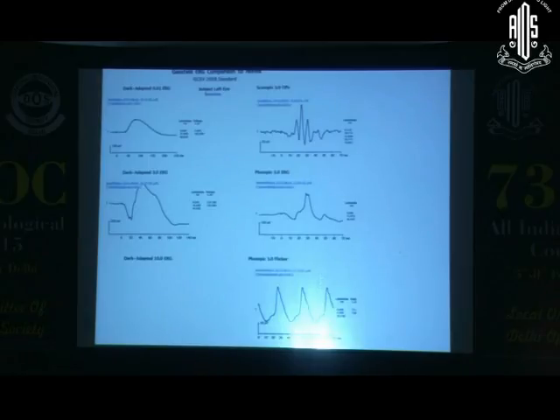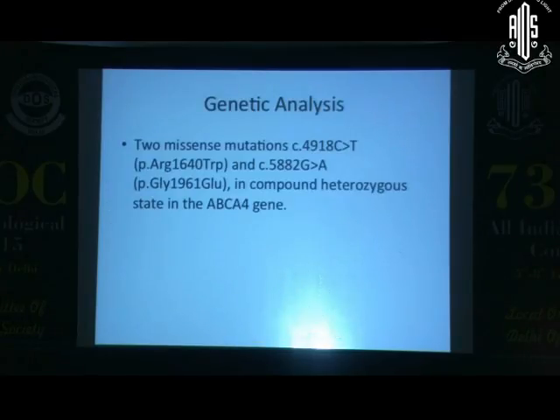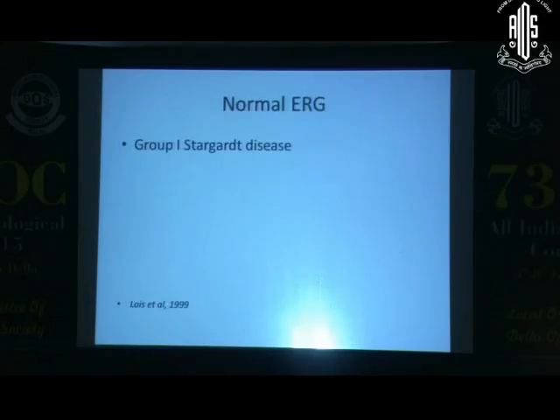So does this mean he has no retinal dystrophy? No. Like what we've been discussing, it only means that whatever the problem he has is not affecting the entire retina, so it is restricted to the macula. If we had done a pattern ERG or a multifocal ERG on this patient, it would have definitely shown abnormality. So this patient has Stargardt, and a genetic analysis indeed confirmed that he's compound heterozygous for 2 mutations.